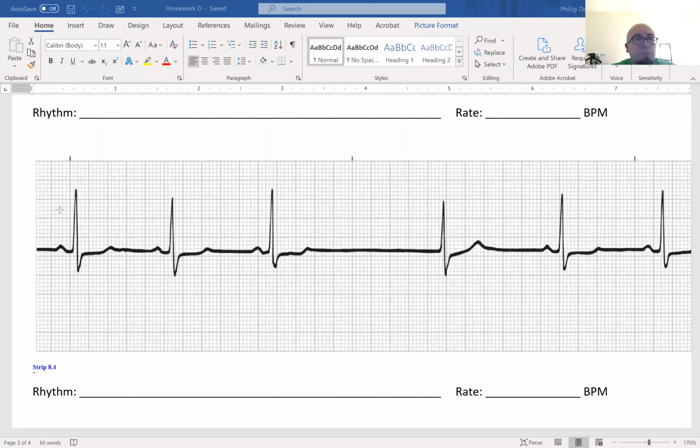Next one. Measure it out. That looks okay. Just about right. All right. And then I should have had a beat fall right here, but I didn't. Slide over. It should have landed there, and then my next one would have landed right here, but it didn't. Okay, and we have this beat right here.